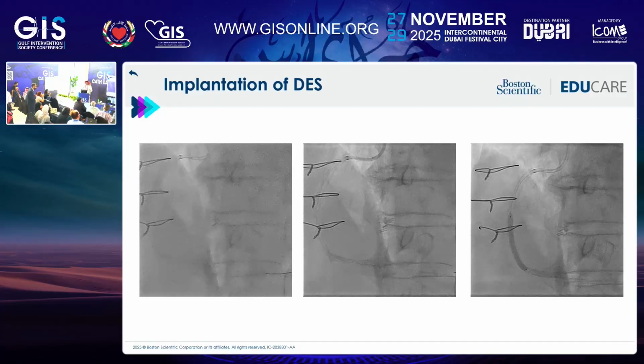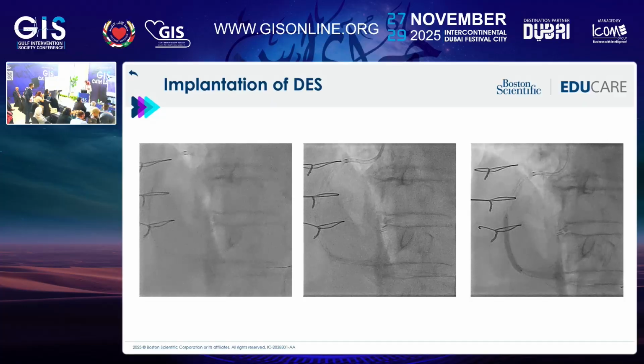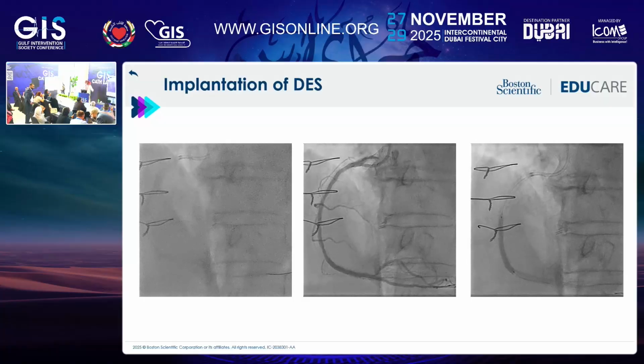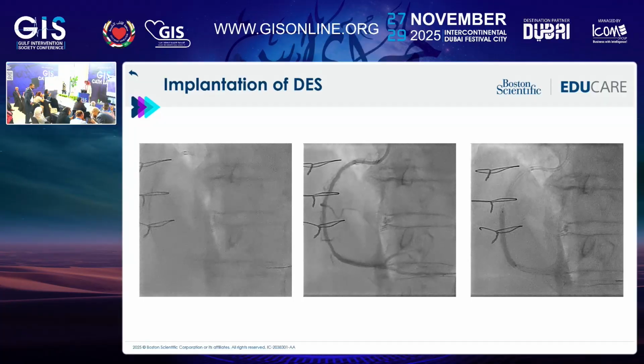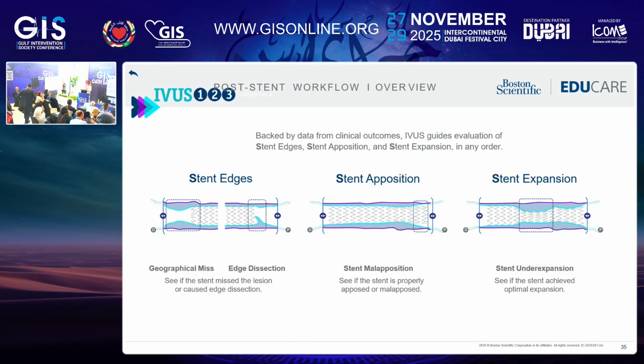Within the stenting, you want to pull the IVUS again. I just want you to tell me what information you are interested in. So there is 1, 2, 3 for pre-PCI, and there is 1, 2, 3 for post-PCI.